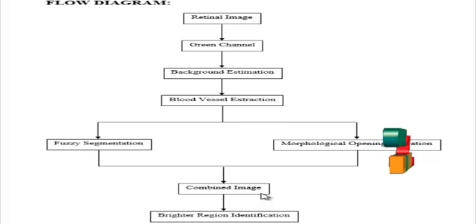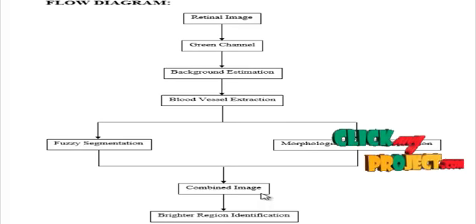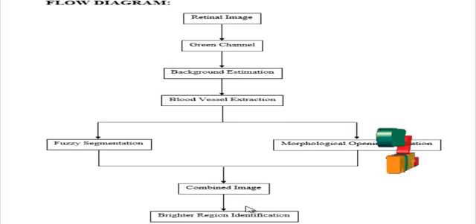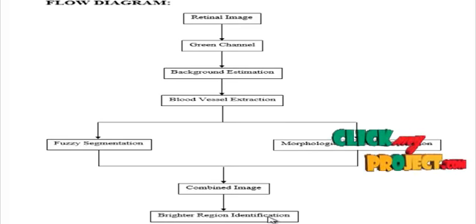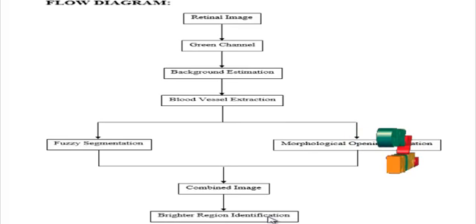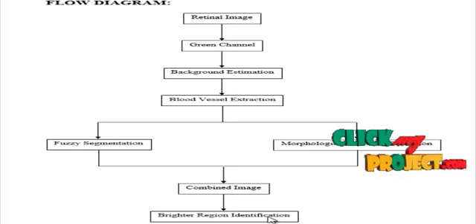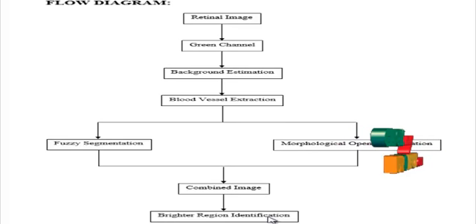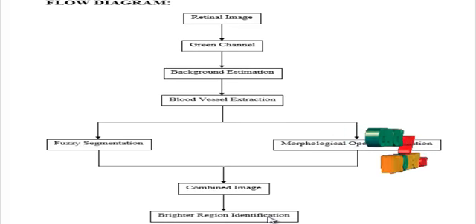And after that, the region of interest is chosen, which is identified based on the brighter regions from the input green channel images. The brighter intensity in the input images were obtained based on the identification of the maximum pixel in the input green channels, and we subtract some 10 pixels from it, and the pixels within that particular ranges were extracted from the input images.